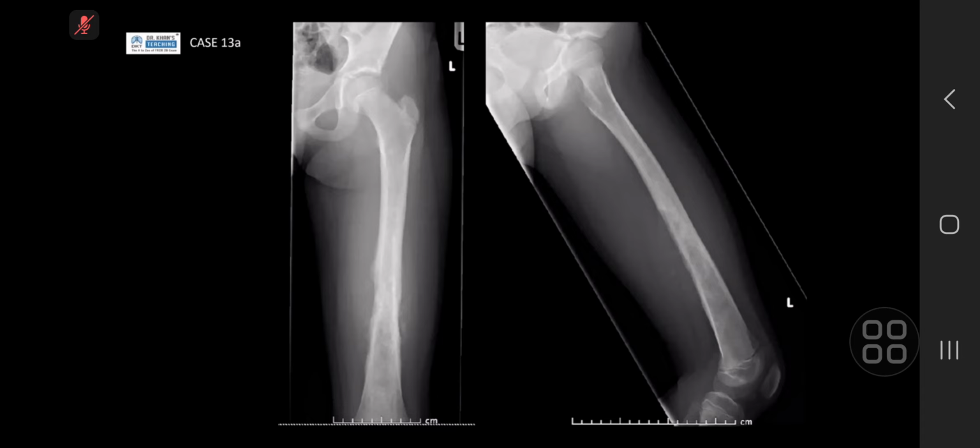There is osteoid matrix, as well as soft tissue close to the bone. And this is a young child. The cortex in the middle of this is likely breached on the medial surface. So there is a wide zone of transition. I'm dealing with an aggressive bony lesion.